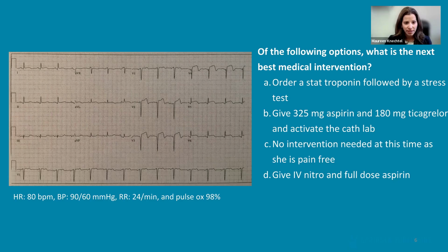Okay, so you'll still have some time here to look at the tracing, but let's pair this with a question. Based on your interpretation of this EKG, what do you think is the best medical intervention? Based on your interpretation, what would you do? You're in charge. Okay, let's see what we've got here.